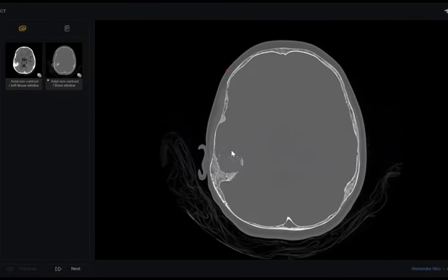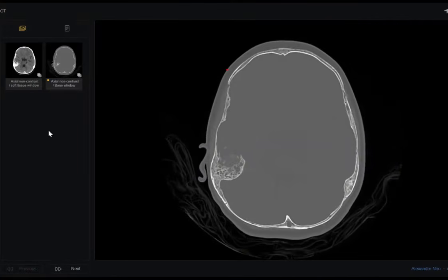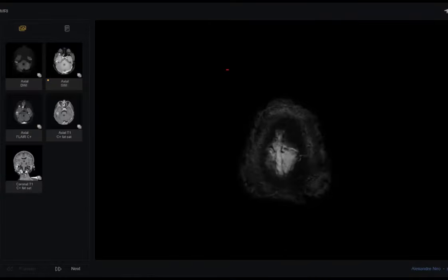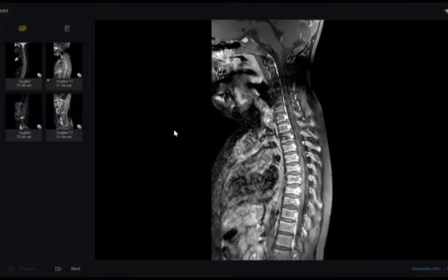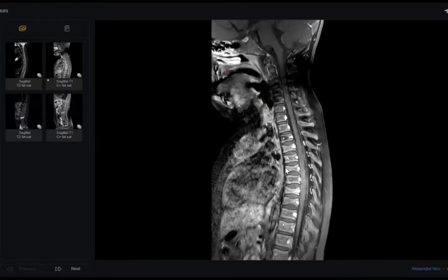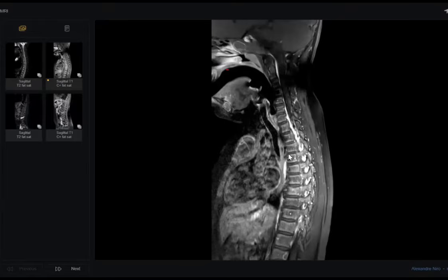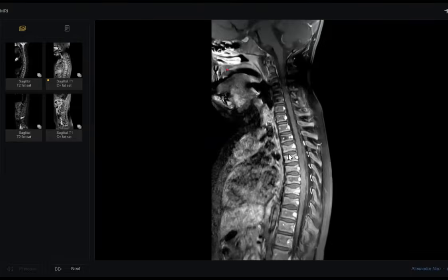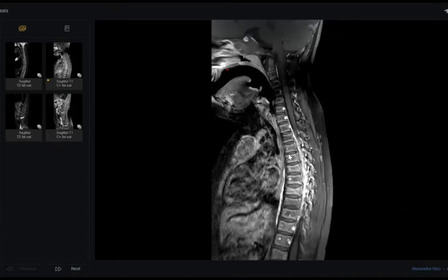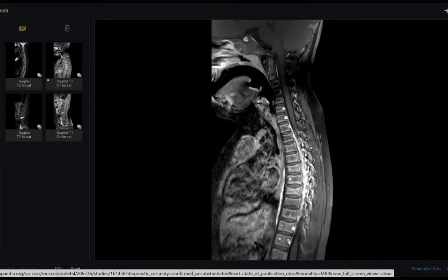Frankly, there is no ground glass here. Okay, my colleague, here in the spine, look here. See? Reduced height, at least in those. And we are searching for vertebra plana. So it was a case of Langerhans cell histiocytosis, polyostotic lesions, versus metastasis. It is acceptable.